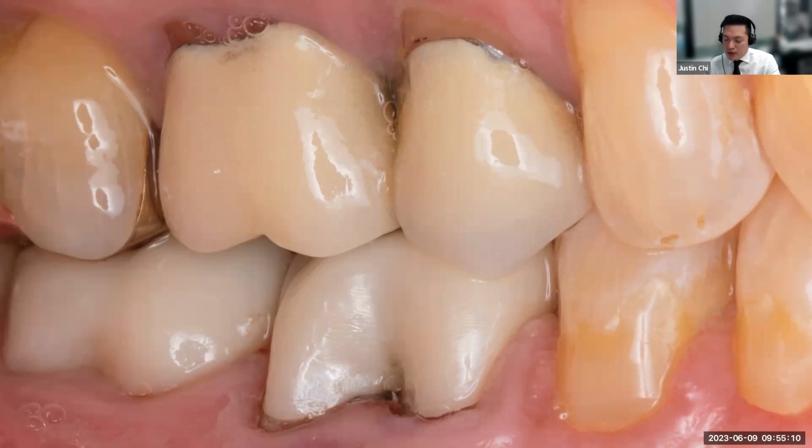Some clinicians I know, when they barrel the furcation, like in this case, like to carry that barreling all the way to the occlusal, where it's kind of this vertical ditching on the restoration to help with cleansing. I'm not a huge fan of that. I just bring it up, as you can see, maybe halfway up. It's still not a normal looking tooth. It's going to be much more cleansable for the patient, but I still like the occlusal to have some bulk to it. So I think it's personal preference, but ideally in a situation like this, we inform the patient that there is a bit more attention required to clean those areas out.